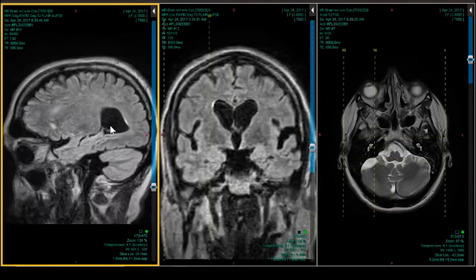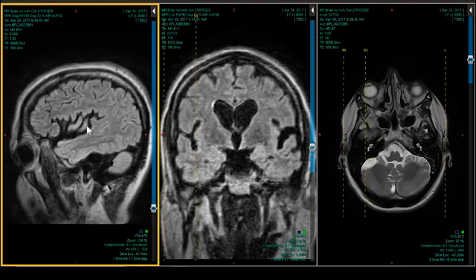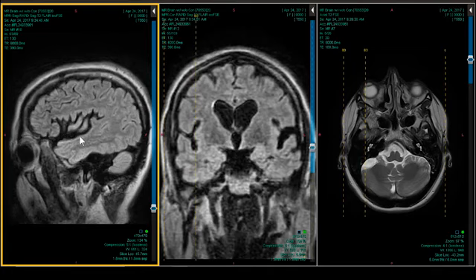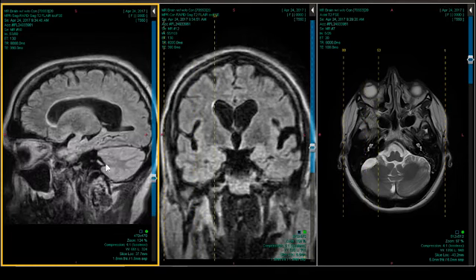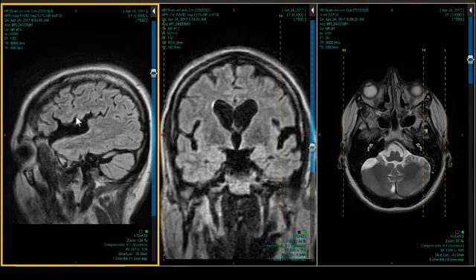Let's check out the sagittal to see the pattern of atrophy in the temporal region. This time, we really don't have that knife blade cutoff sign that you saw before. We do have atrophy. Looks like it involves the parietal operculum and, to a lesser extent, the temporal operculum. This is the operculum. The Sylvian fissure delimits the frontal lobe, the frontal operculum and temporal operculum, not parietal, frontal. And so the Sylvian fissure delimits those two. Let's go to the other side and check out that temporal lobe. And it's pretty symmetric, really, on both sides, frontal and temporal operculum.